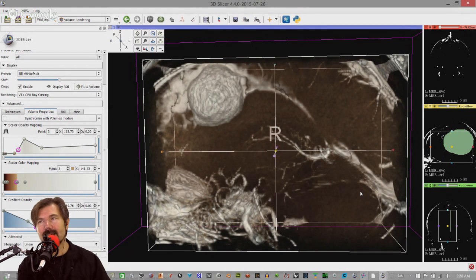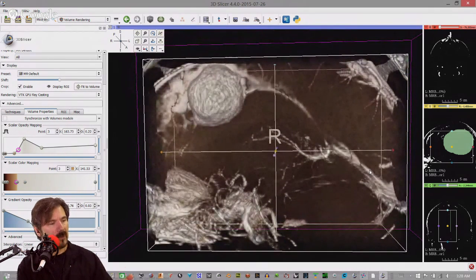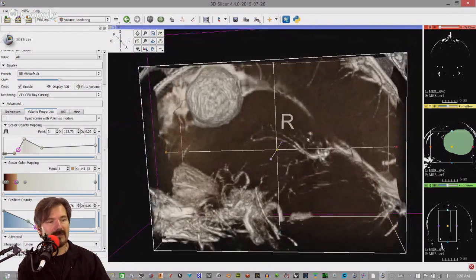And the problem with DICOMs is they only give you grayscale information. They don't give you the spin. They don't actually get the acceleration. So you don't see any of that information. But whoever created this particular MRI data set also used some color cueing, and that's what I'm isolating. What I notice when I isolate, I'm assuming the gray matter, I am left with a lot of just vascular.